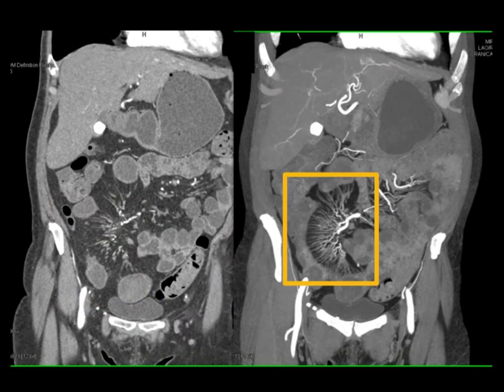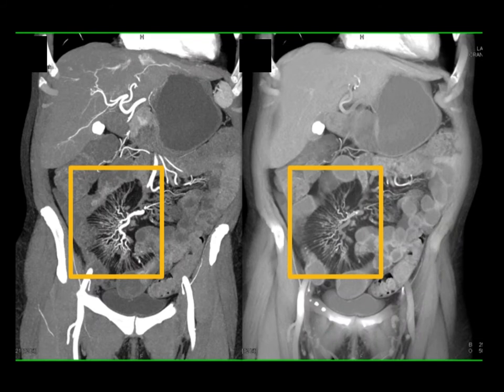And then as you go from the coronals and you go to the MIP imaging, look at the vasa recta, which means the patient not only has Crohn's and areas of stricture, but has active disease, and that's very nicely shown in this example. You can see both the MIP and then the volume rendered image on the right. Just slight differences. The volume rendering gives you a better feel about the small bowel, for example, but just a very easy way to do things.